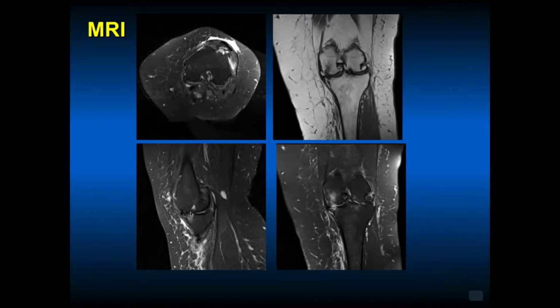And then this is all the osteoarthritis that you can see with the bone edema, and her menisci definitely are abnormal. You can also determine the thickness of this soft tissue, which goes along with her morbid obesity. So consult an orthopedist before getting an MRI scan in the morbidly obese older individual, because the MRI is going to be abnormal and does not affect or change the management of this patient. More tests needed, certainly not more diagnostic imaging tests.